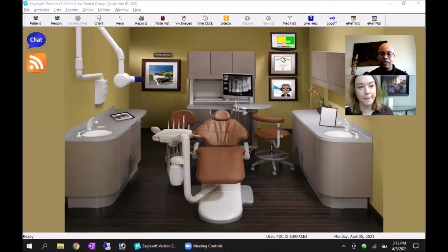So a little bit more intense, a little bit outside the just basic stuff, but the idea of basic sort of overlay with this, because almost every office, if you place implants or not, are still going to see your patients who have overdentures, who have implants, who you might be just replacing the locator rings every now and then for them, but you know, it's a good practice to know all this stuff long term. So we're going to dig in. How's that sound? Sounds great.